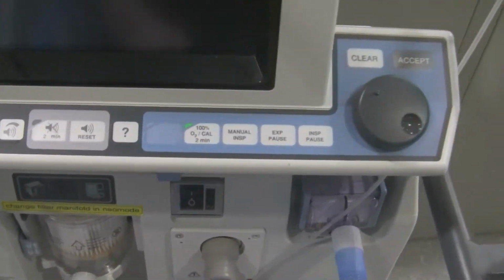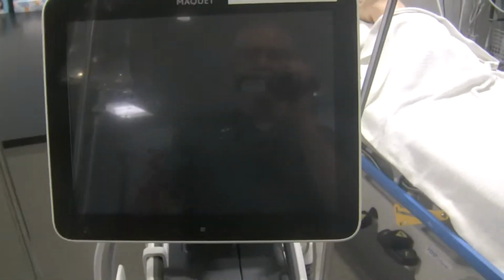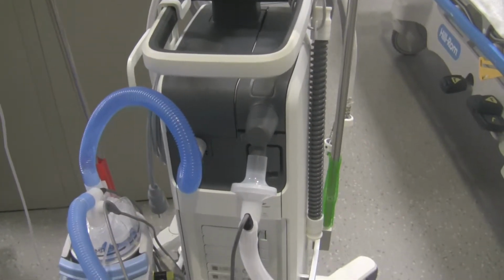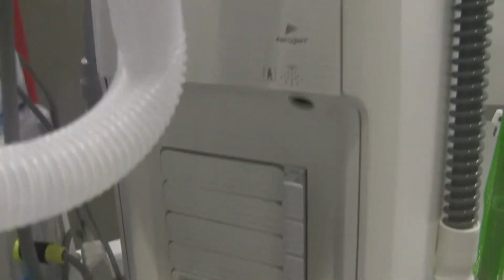On this ventilator you can see some of the things that you can set with these toggle switches. This one doesn't have it. Anyways, there's going to be a screen that allows you to see all the data and may allow you to do some of the programming. There's going to be the main body where the gas comes out of the ventilator and goes to the patient. There's a place for software upgrades. You can see it behind here, all those little slots. That's where the upgrades go. So you've got your powering unit right back over here.